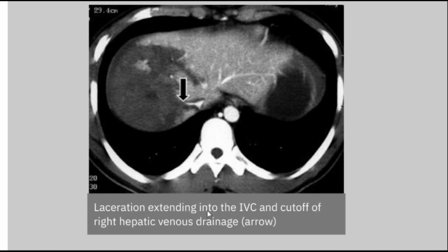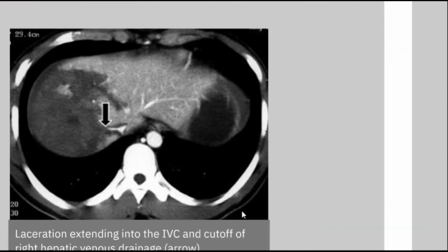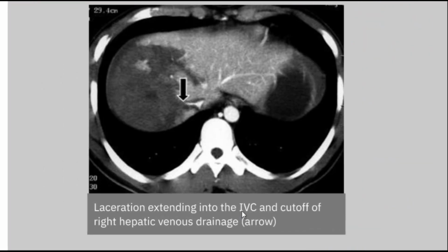Okay, and even the laceration could extend to the inferior vena cava. So in fact, it's not cut off blood supply. Yeah, it's cut off hepatic drainage, or venous drainage. Okay, yes. The blood is coming in, it's not going out.